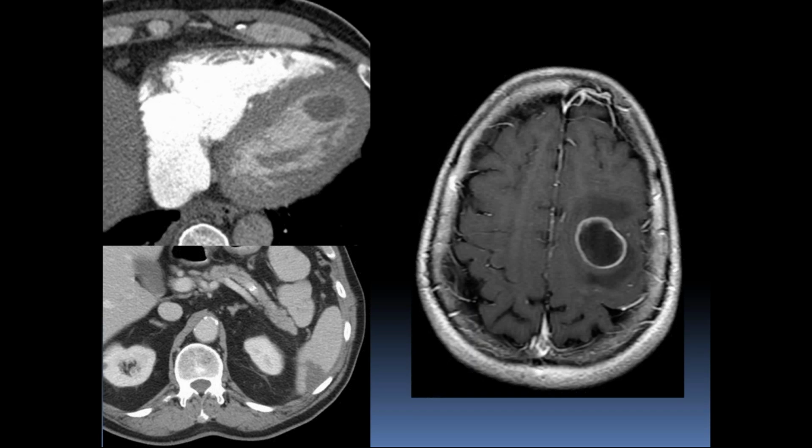Now this last one, everybody knows the differential for something like this in the brain. Neuroradiology seems to be a lot more exciting than chest radiology, so you learn this typically in your first year, and you get to know the differential and how to use it. But it all depends on the history. Did the patient have HIV? Or did they have lymphoma? Have they had radiation? It really comes down to what's going on with the patient to help you narrow down the differential.